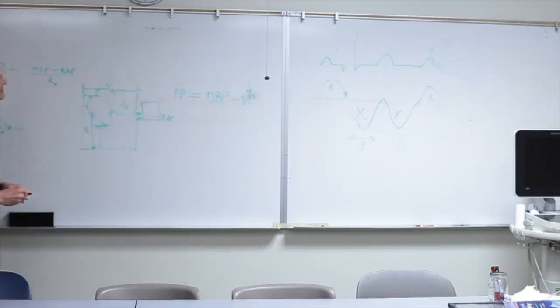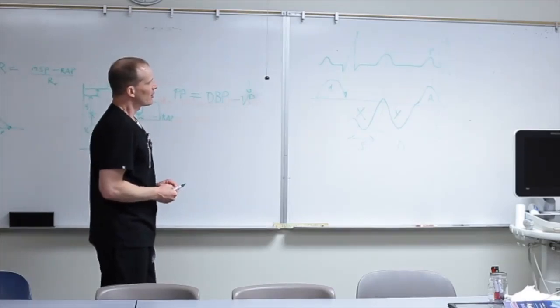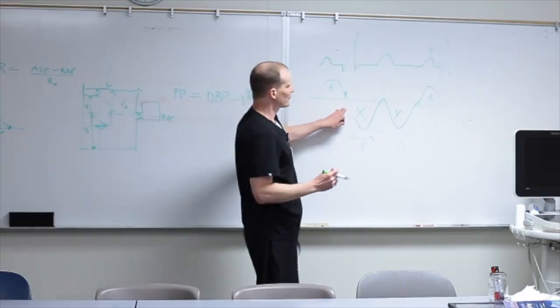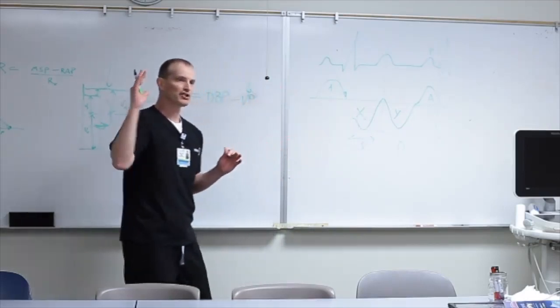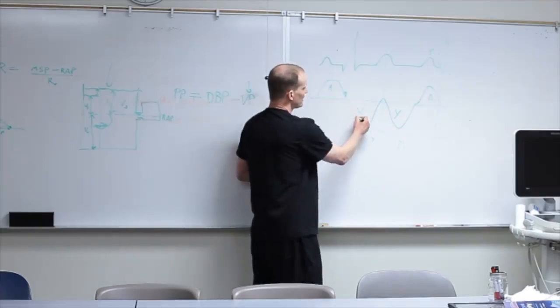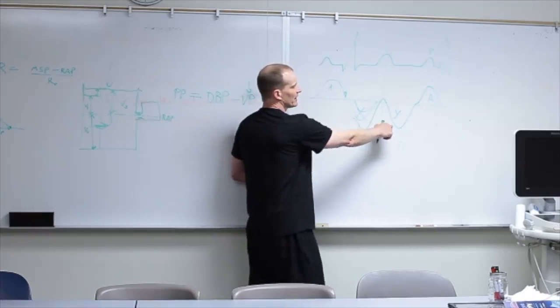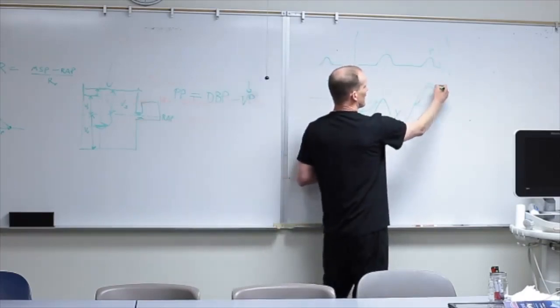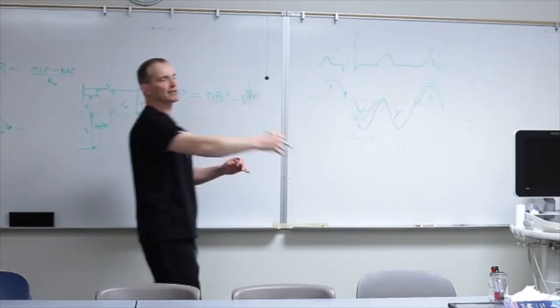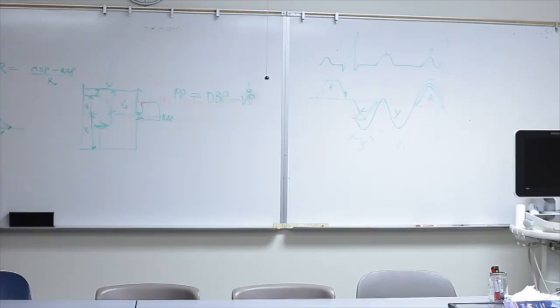And what happens is, as the right atrial pressures go up and up and up, there's inhibition of venous return, okay? And so this wave will get smaller and smaller compared to this one. And this wave, as pressures go up, will get bigger. There'll be more and more reflux back because we're getting congestion. Things want to go backwards more than forwards to a greater extent, okay?